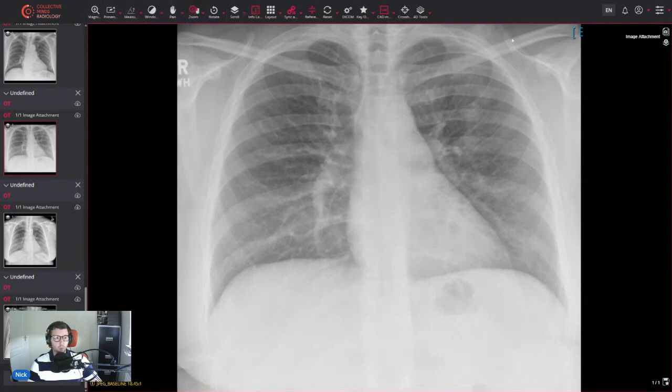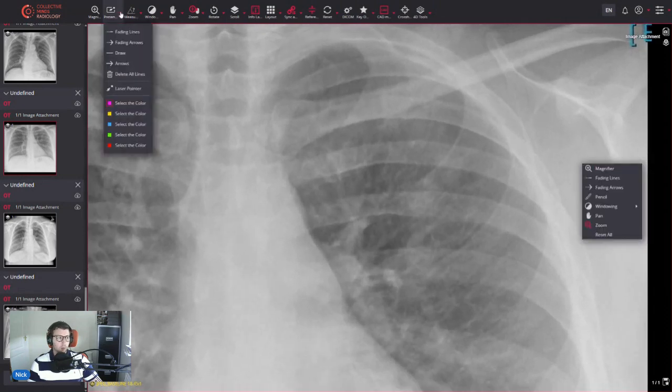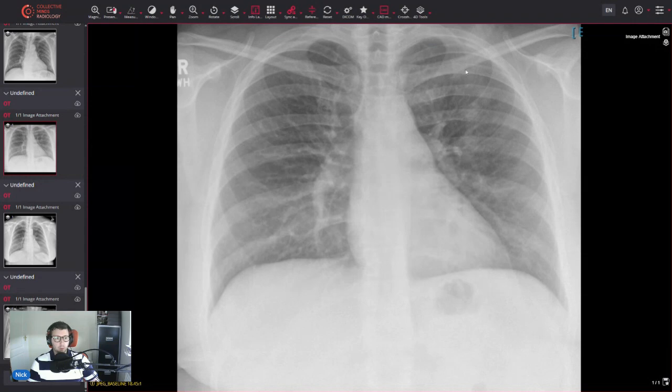On this chest x-ray, we're only concerned with this area. And at first glance, it looks quite hazy, patchy. Possibly some early developing infection. We might consider doing a repeat chest x-ray in 6 weeks to reassess after treatment to see if it's gone. But on closer look, if you look up here, you can actually see some of that patchiness coming out beyond the chest wall. So this is in fact a hair artifact. This is a hair plait, which is overlying the upper zone.